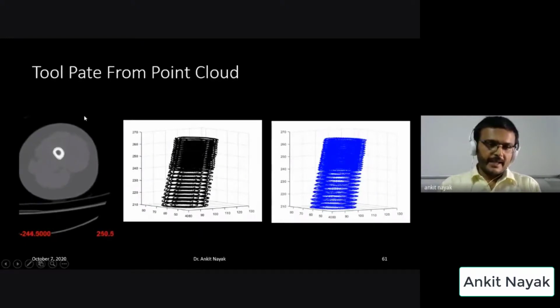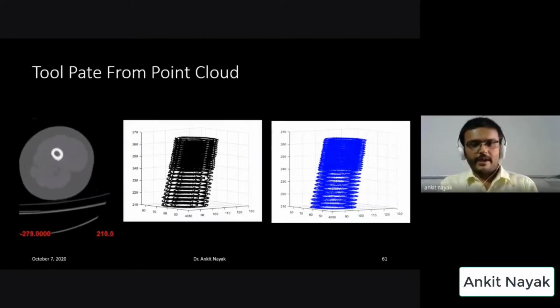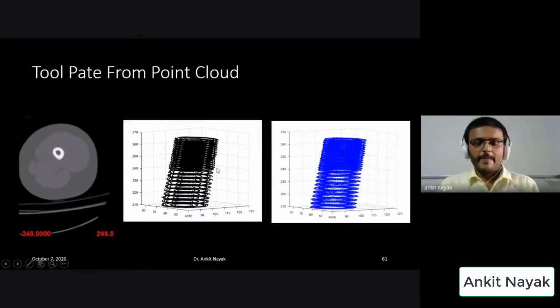Here is another thing. Here it is the CT scan image. You can observe it is the GIF image I have used, and I want to segment out this part. So I have applied some operations in MATLAB. If anybody is interested, then I can show you the easy programming of MATLAB to segment out this part.